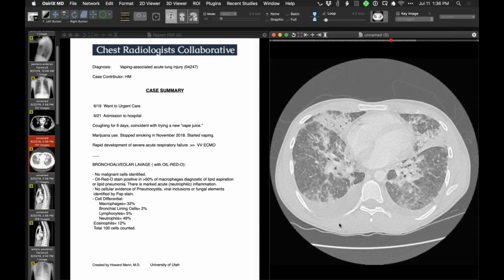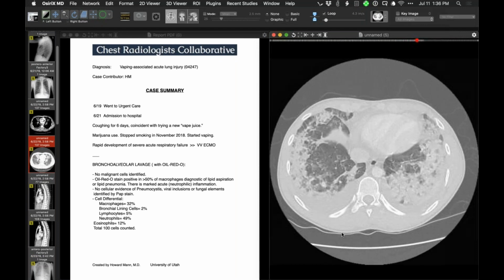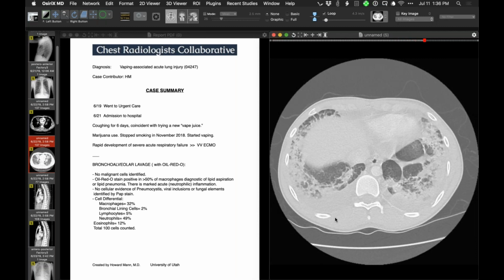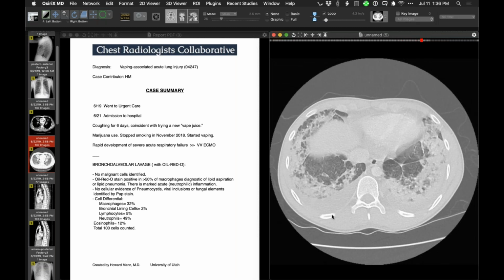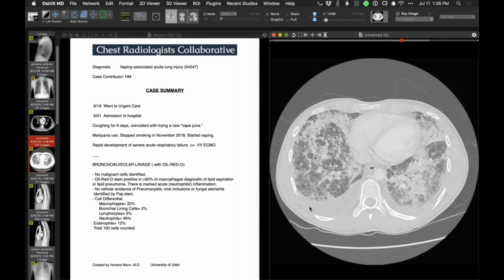That's why I wondered if that was a component of this. That could definitely be acute eosinophilic pneumonia. Absolutely. And even some of that down there definitely could be. But maybe a component of this is also just acute lung injury because he's got mobilizable pleural fluid. Presumably, the pleural fluid has come from the lung. So there is acute lung injury and lung water. But how much of this is eosinophilic pneumonia? I don't know.